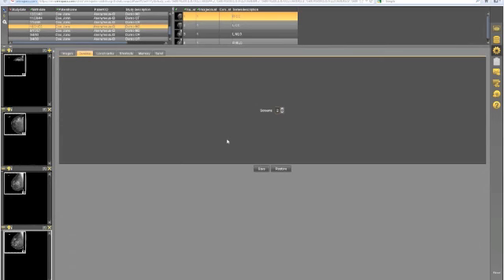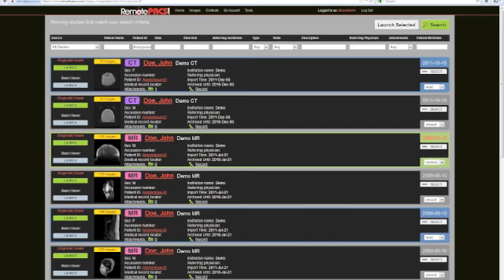So those are the key features within the viewer that I wanted to cover briefly. Now, I did kind of a quick run through on it, so if you have any questions about that, please post them on the side there in the GoToWebinar software, and I'll come back and answer them for you. So I'm going to go ahead and close out the viewer now, and I'm going to launch the basic viewer.